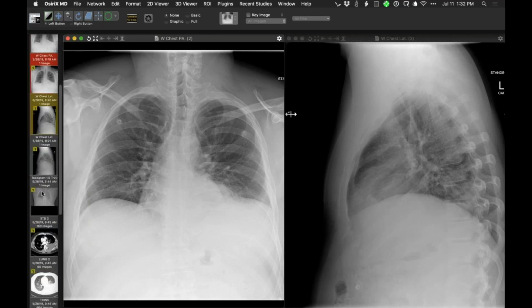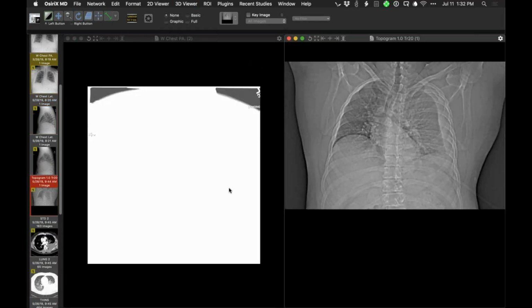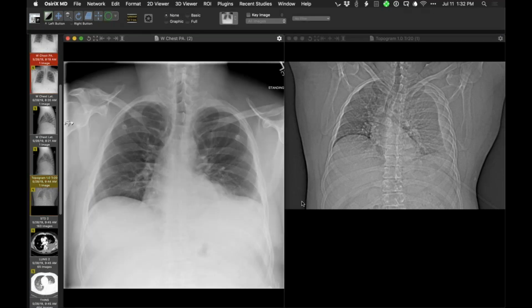And here is the image from a CT that was done soon thereafter. Let me just fix that up. Bring that back again. And you can see that when the person is recumbent, the pleural fluid that is subpulmonic in location, that is here, flows out right there.